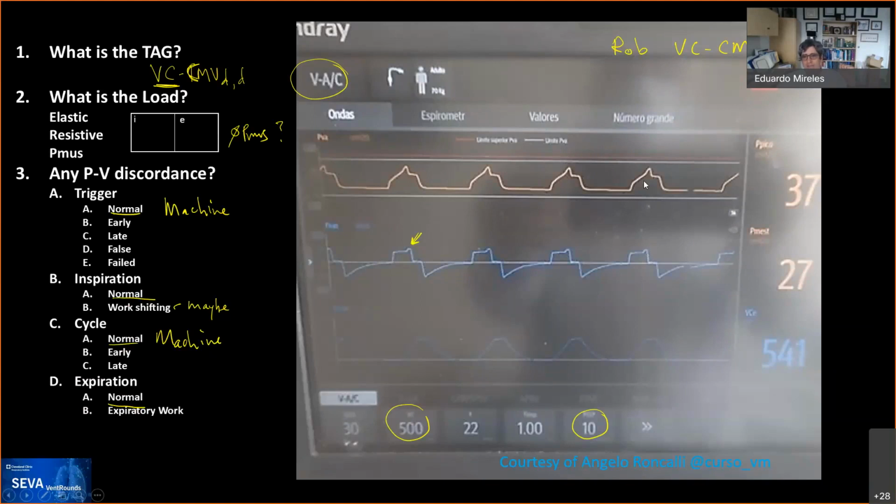The key message in general that I would say when I see these waveforms is, if there is a change in the flow, you cannot estimate the stress index on this waveform, because then it's going to change the pressure waveform, and it will give actually a false finding for your stress index. So it has to be a square wave flow waveform. Yes, exactly. The bump in pressure has to be coming from the bump in flow.